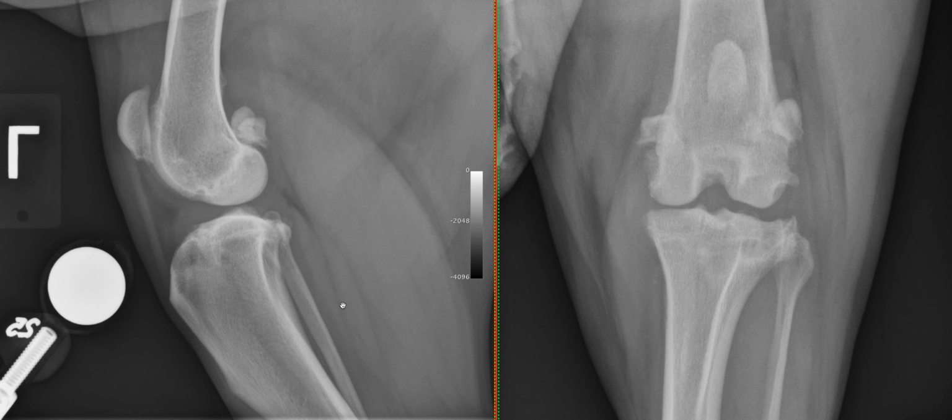We can also assess the caudal fascial planes. They appear as a radiolucent line here at the caudal aspect of the stifle and the proximal tibia because, again, of the presence of fat in that region. So you can see that those caudal fascial planes are a bit displaced caudally. Normally they would follow a bit more closely the bone, but here they are displaced by this soft tissue opacity, again at the level of the joint space. On the craniocaudal projection, we can also assess if there is widening of the medial aspect of the joint space, which is also a sign of joint effusion.